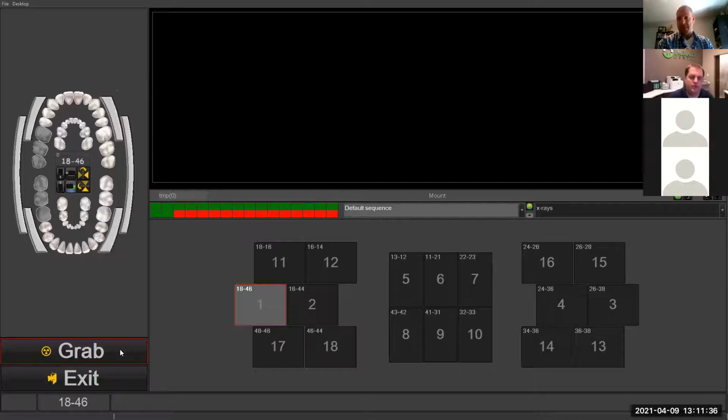But now, is this smart enough that if we set up different mounts, like sometimes we're doing endo or whatnot, depending on which side of the mouth, to flip it, we're always having to manually flip it. Can we set up different sequences so we know if we're in upper right or lower left, it's going to be one way? I'm assuming we can program it that way, so we don't have to continually be flipping our mounts.